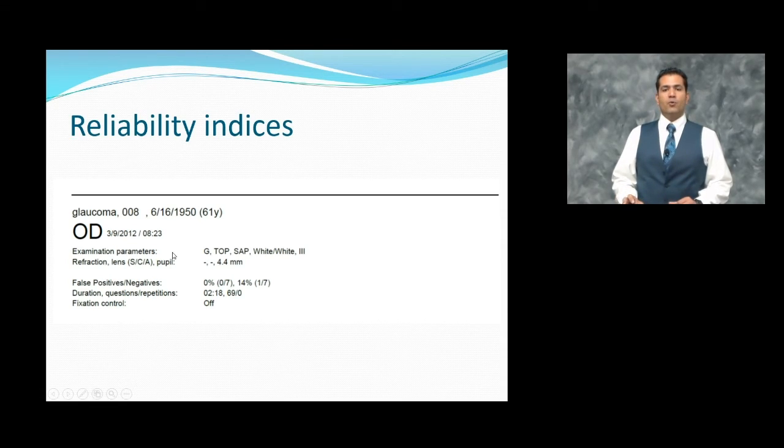The other parameters that one should pay attention to is the strategy of the test that is performed. Here, this is a G protocol, TOP strategy, meaning tendency-oriented perimetry. It is white-on-white perimetry, standard automated perimetry. Also check the refraction, whether it's input correctly, or sometimes you don't want any refraction to be put in, and the pupil size. Anybody that has a pupil size less than 3 millimeters, one should consider dilating, particularly if there is a cataract or a media opacity. The other important parameters in terms of reliability indices are the false positives and the false negatives, and they both should be less than 15%.